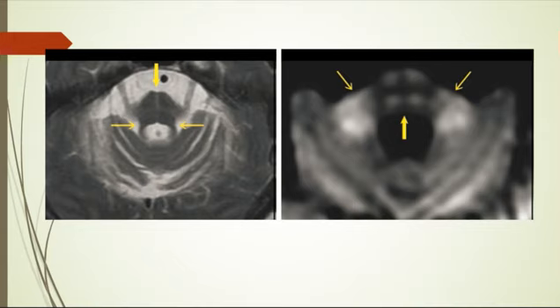Joubert disease. No. Creutzfeldt-Jakob, which is mad cow. Anyway. Molar tooth. One of the possible differential diagnoses is Joubert syndrome.